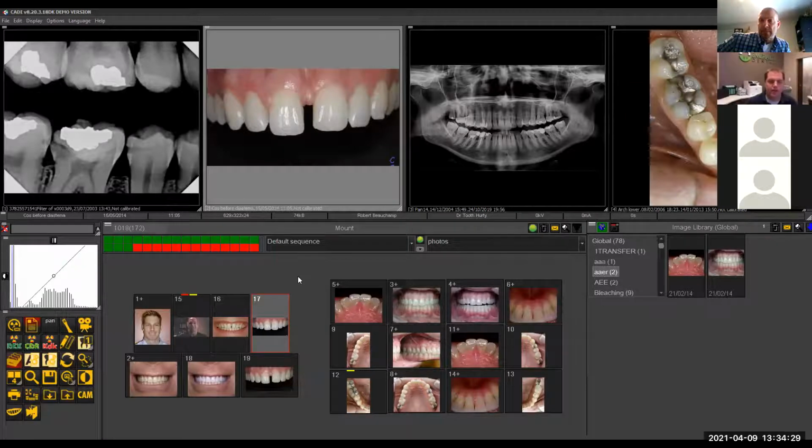If there's automated ways. Right now I've just got a file system. I'm importing them manually, but I was wanting to do some type of, they used to have what's called iFi. I have a bunch of those cards where it automatically connects directly to the computer without having to plug it in. I'll see if we just manually import them, or is there any way to actually acquire it directly into the software? With SLR, it's a little tough.